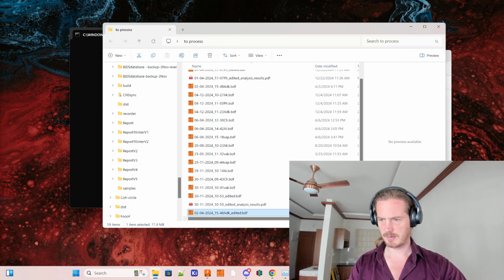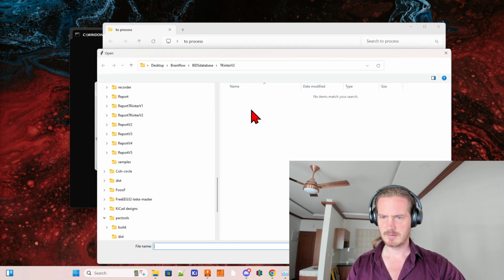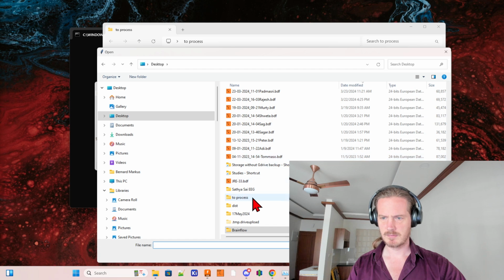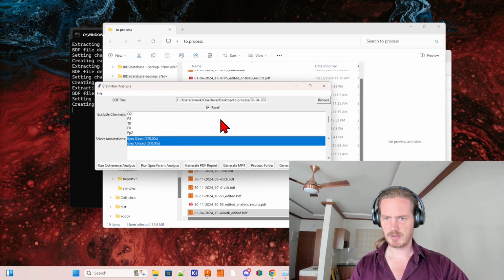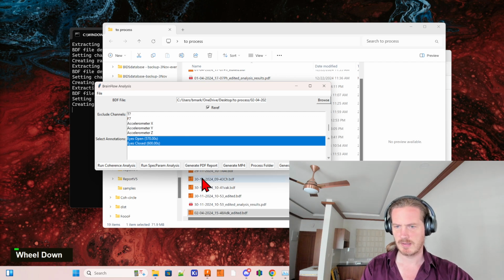All right, now this file. It takes a moment to load, and then it tells us we have the eyes open period, we have the eyes closed period. Here on top we can exclude certain channels. I'm not going to use it for now. So I'll just generate the PDF report.